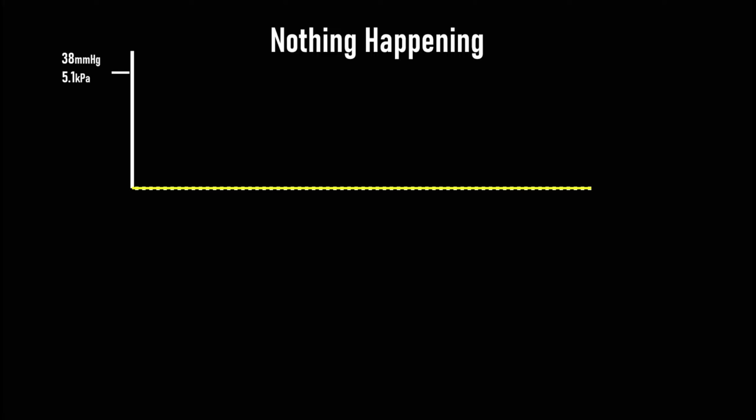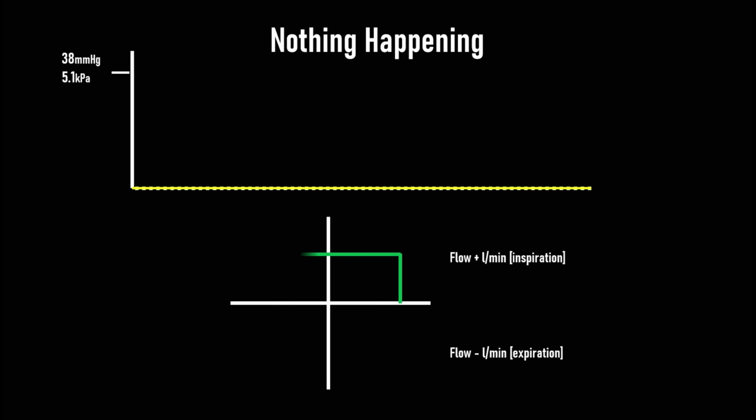I want to draw your attention to another waveform that you likely ignore on the screen of the monitor or ICU ventilator, and that's the flow volume loop. As you can see in this situation, gas is flowing in and out of somewhere that looks remarkably like the lungs. In this case, there is not a CO2 trace, but there is a trace.